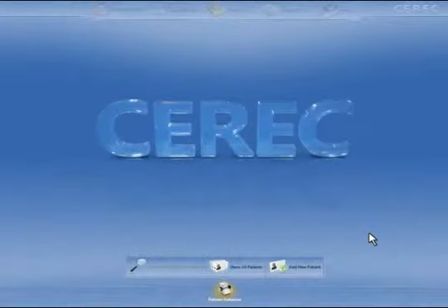This video is for internal demonstration purposes only. Cerec scans are normally always taken directly in the patient's mouth.